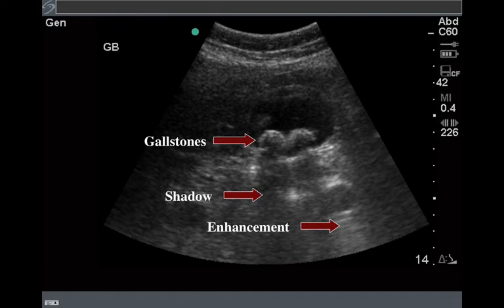And so the tissue down here, although it's exactly the same as the tissue here, is portrayed as brighter, whiter tissue. The tissue here, the ultrasound beam has been weakened all the way. By the time it bounces back, it's relatively weak. Although it's the same tissue, the strength of the returning echo is weaker, and then the picture that's made is a darker picture.